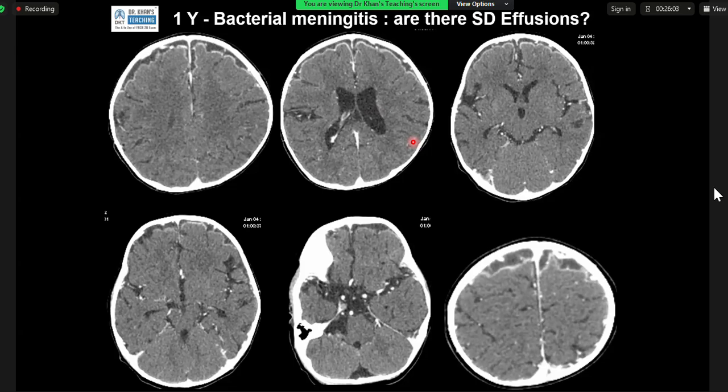Subdural effusion. So there can be fluid in the subdural space because of infections, etc. And in this particular case, it is not subdural space because it is subarachnoid space, because the vessels are inside. So there is no subdural effusion, but this might be an incidental finding of prominent subarachnoid spaces, which can happen and should not be confused with atrophy.